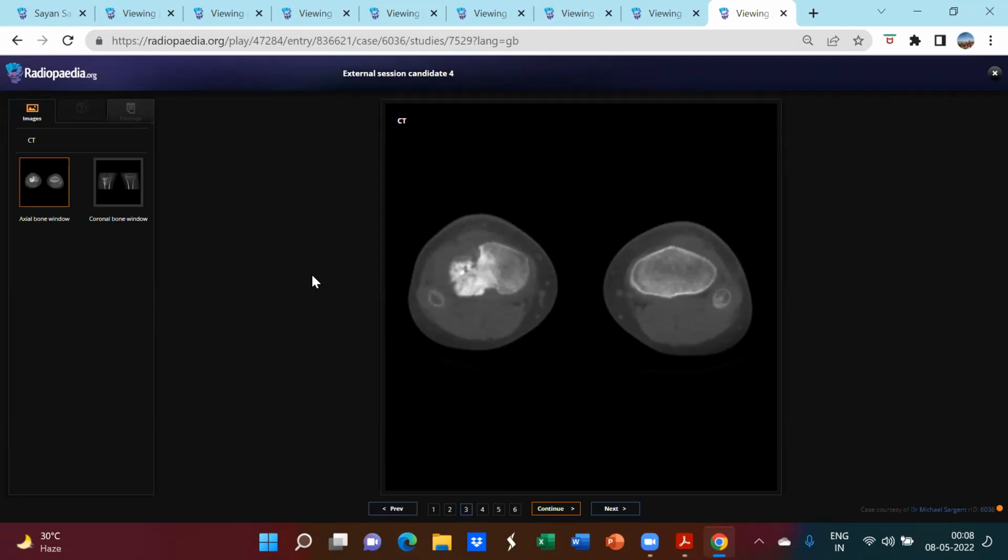There are a few lesions. You think it is? It's a predominantly osteoid matrix. Although there are... so what is it? What are the things which have osteoid matrix? Well, if I try to enumerate all of them, osteosarcoma, for which the patient is quite young. What does that mean? What is the age for osteosarcoma?